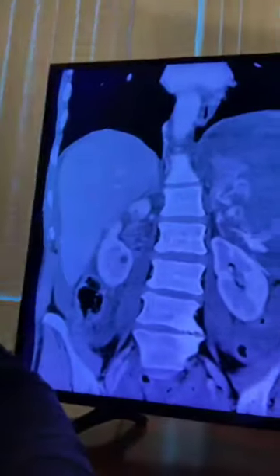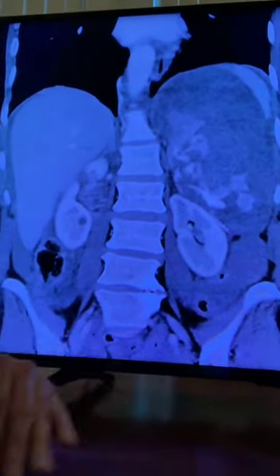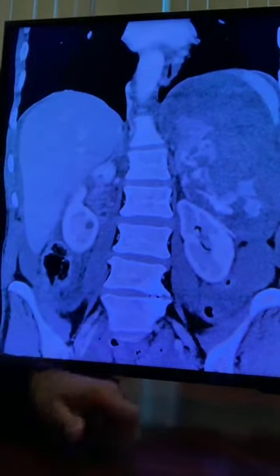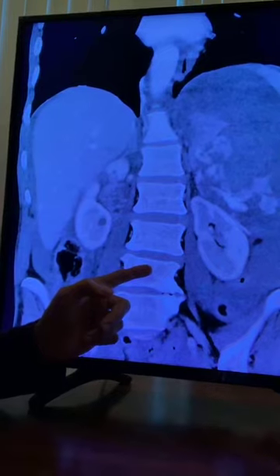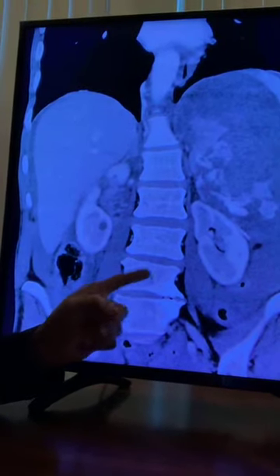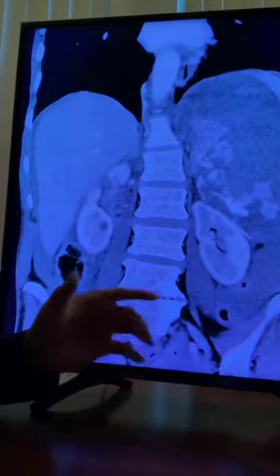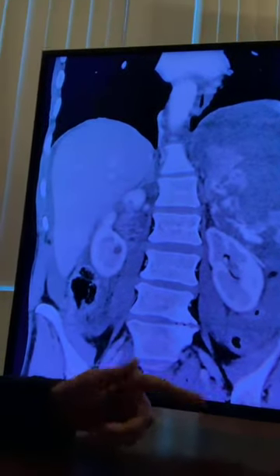So first of all, what modality is this? What are we looking at? Is this an X-ray? Is this an ultrasound? CT scan, MRI? Some of you guys may be like, man, why are you asking that? That's too easy of a question. But hey, everybody's on a different path, right? Everybody knows more or less than the other person. My general rule of thumb is look at the vertebral bodies. If they're super, super white, it's a CT scan. If they're darker or completely black, it's an MRI. General rule of thumb, remember that, all right?